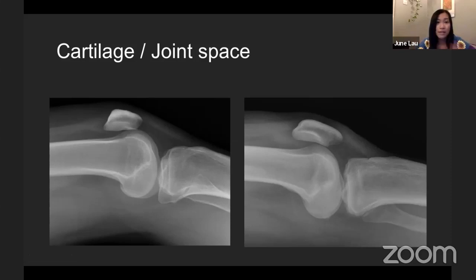But you have to understand density. If we look out here, it's black. Black is air on an X-ray. Slightly less black tends to be fat. Then you've got soft tissue, so you've got all your tendons here. That's a medium gray. Then you've got your bone, and obviously the most dense thing on an X-ray is going to be metal. So if you are looking in the region where you expect an effusion to be, and it looks the same density as soft tissue, then you can be quite confident that this is an effusion.